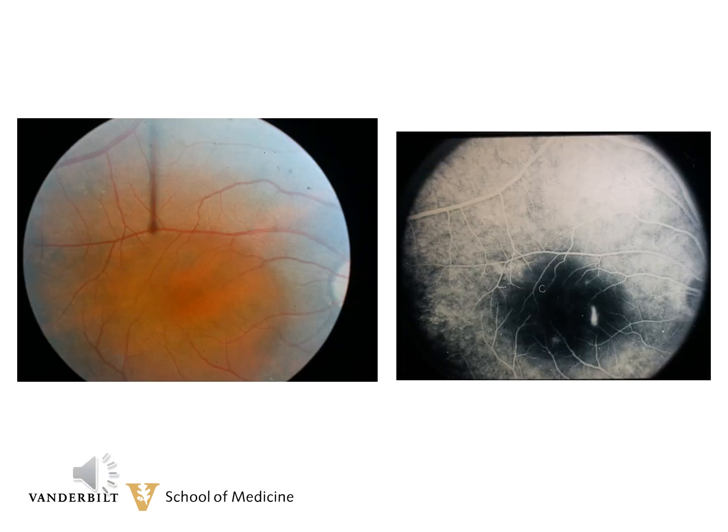This patient has a neurosensory detachment from central serous choroidopathy. The photoreceptors are lifted away from the pigment epithelium, and that space is filled with serum, which is why it is called central serous. The clear elevation can be seen easily on the color photograph.